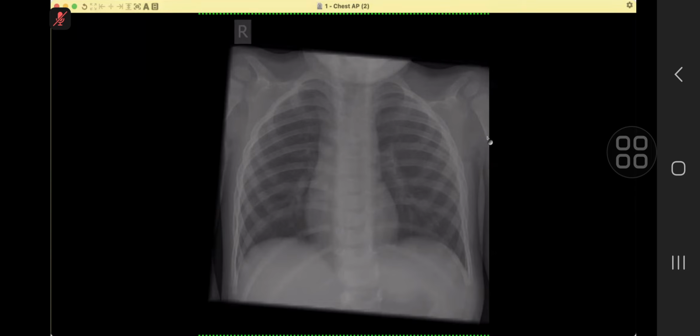Sir, I believe that this is a case of cleidocranial dysostosis. And why do you say that? Sir, because I cannot see the clavicles. Okay, so what is your differential? Sir, my differential is that there are some other syndromes as well in which clavicle is not seen, and maybe pycnodysostosis, but there are a few other rare syndromes in which absent clavicles are seen.